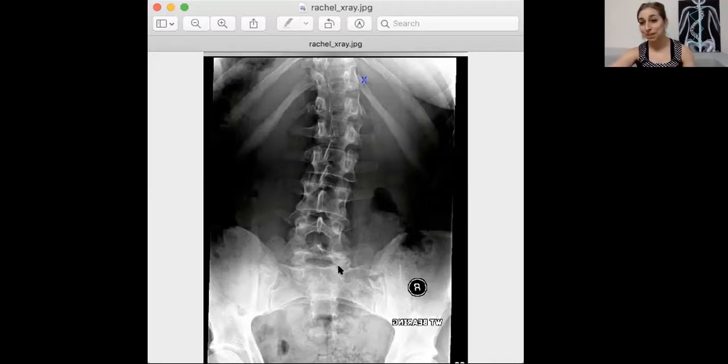If you have more questions about that, feel free to message me. The reverse can happen too. Some people only have 4 lumbar vertebrae, 1, 2, 3, 4, and the sacrum decided to take an extra segment. That's important because either one of those can contribute to pain, and it affects the way that the spine is balanced.